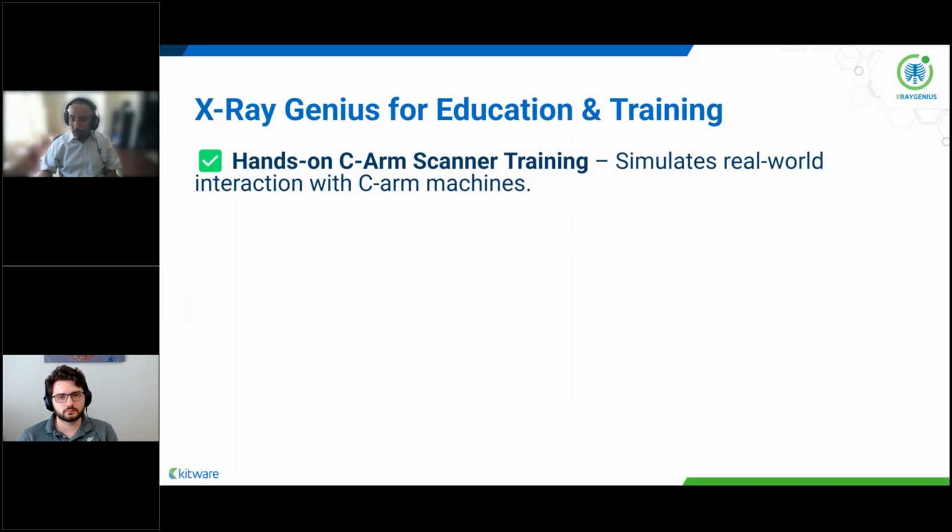Just to go over some of the concrete areas where X-ray Genius can be used. For example, we have customers that are looking at using X-ray Genius for education and training. When you're looking to have training on real-world use of C-arm scanning, X-ray Genius is very useful. It has a very intuitive visualization.